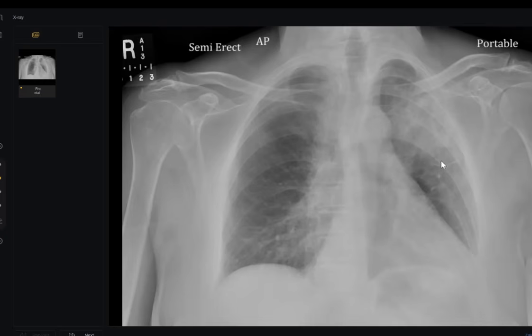Why? Because if this were pneumonia, it would not cause volume loss. So, doctor, it is an opacity obscuring anterior ribs and causing volume loss at the left side in the form of shifting of the mediastinum and elevating the left hemidiaphragm. So, doctor, most probably this is a mass. Okay, because if you look very carefully, it is a little bit ill-defined, so it may be confusing.